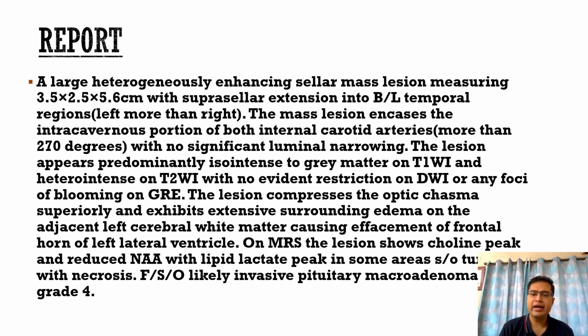There was no pituitary gland visualized separate from the lesion, hence this was a pituitary lesion, and the lesion predominantly appeared iso-intense to gray matter on T1 and heterointense on T2, with no evident restriction on DWI or any foci of blooming on GRE. The lesion compressed the optic chiasma superiorly, because of which the patient had blurring of vision, and it exhibited extensive edema in the adjacent left cerebral white matter, causing effacement of the frontal horn of the left lateral ventricle, which was seen on the axial as well as the coronal images.